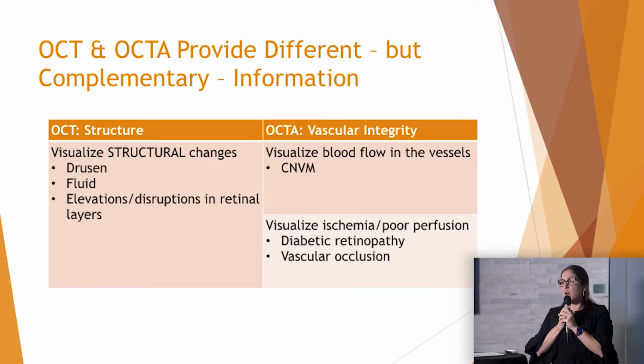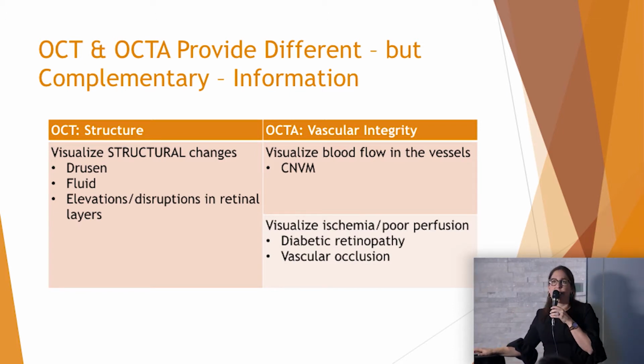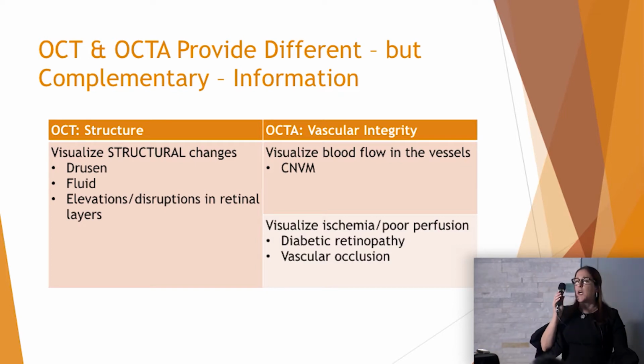What about not enough blood? Microvascular disease, diabetes, vascular occlusions, okay? So again, side by side, these technologies make a perfect image or a perfect page of information. So how does OCTA work? I'm going to talk you through this really quickly.